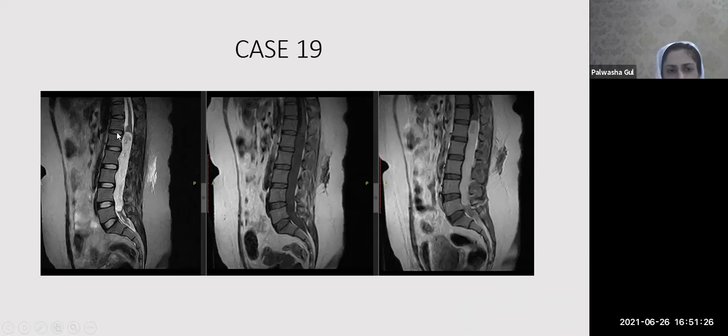However, in this particular case, I do not see a hemosiderin cap. But these ependymomas, we are always in exam. We are always told, if we see a medulloblastoma, the next thing we are going to advise is imaging of the entire neuraxis because of the drop metastasis. Ependymoma, okay, in the brain, let's think you are dealing with an ependymoma, even that will cause drop metastasis, though not as common as medullo, but it will cause drop metastasis, okay? First, think about that concept.